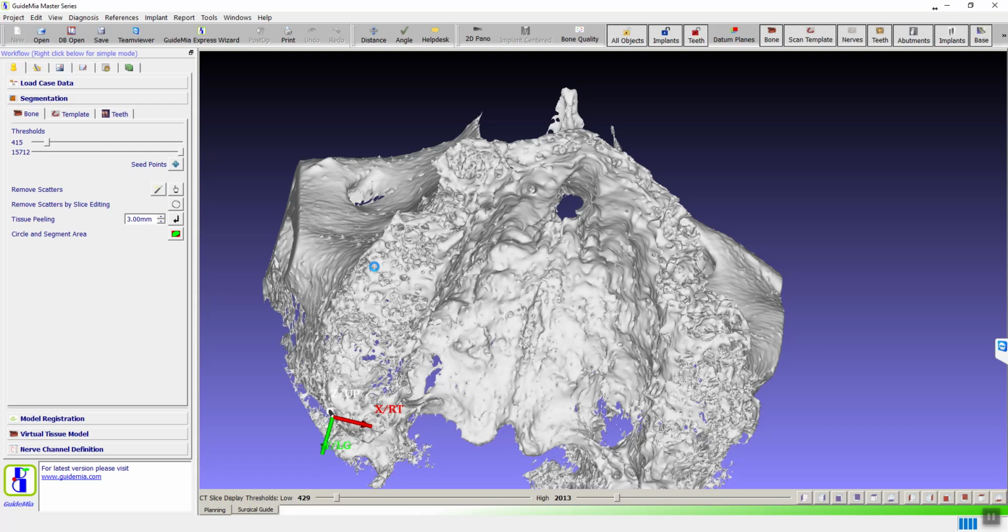This step is very computation intensive, so it takes many steps to get there, although it's automatic. So it will take a while. We'll have to wait a minute or two. This is a very special step, a very necessary step for bone reduction, bone level surgical guide.